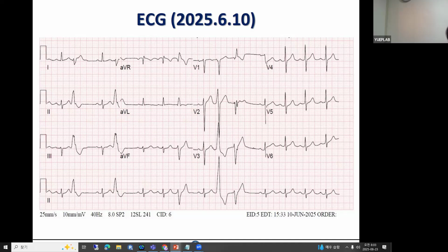There's a small high frequency signal there, a local one, and then you go down quickly. So there's an initial delay there. It looks like the bipolar electrogram. But in the right bundle it is all atypical because of the initial q.